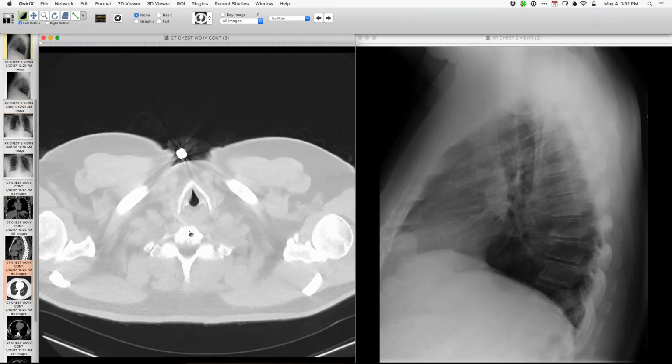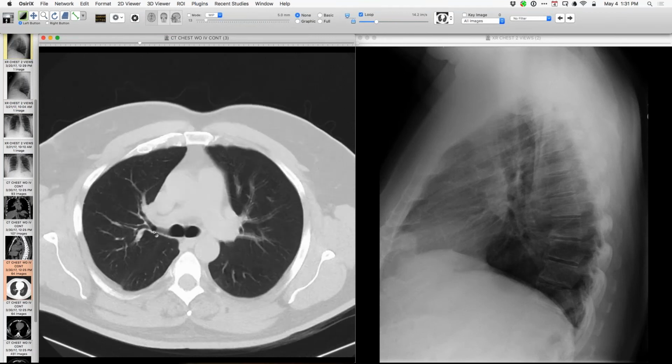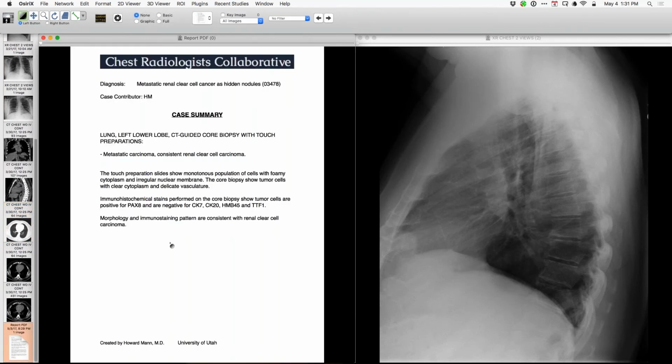And basically, I put this in my to follow up list, having described lots of nodules and waited for the biopsy, which of course eventually did happen. So here is the diagnosis under the microscope, consistent with metastatic renal cell cancer. I looked for additional adrenal imaging, but renal imaging, but I haven't seen any yet.